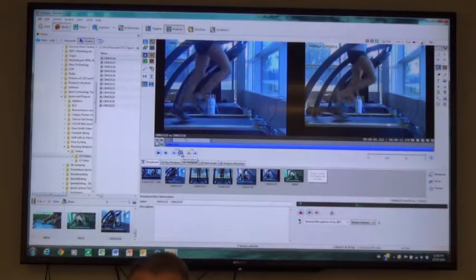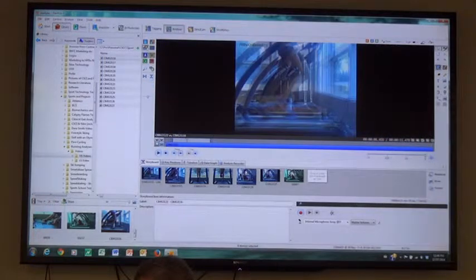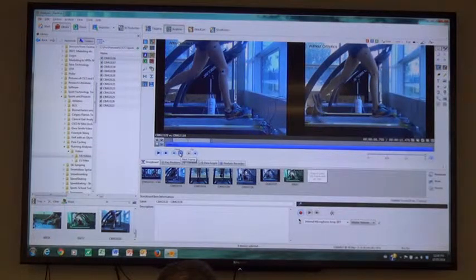So now if we want to do a quick comparison just to visualize what she was doing, we could even do some overlaying of videos. So if we do the basic blend feature here, we can see one foot versus another. Now the videos weren't exactly zoomed the same way, so maybe that comparison isn't too good. But if I want to take a look at angles, for example, what kind of angle is her foot making at contact?